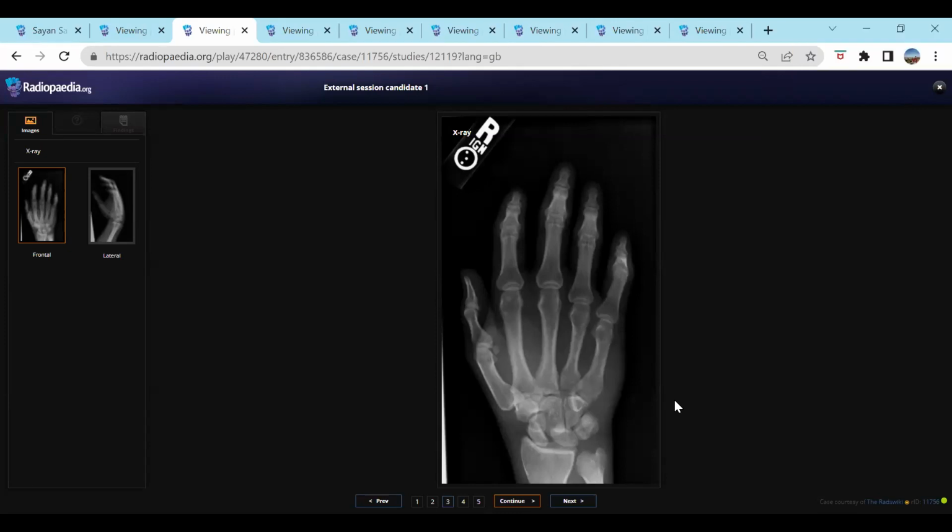Yeah. So I was ruling out first any arthritic changes and any fracture, because since the patient presented in ER, fracture was my first priority to rule out. The patient has come with a sports injury. So, I mean, you don't have to rule out arthritic changes in this. There is an increased gap between the lunate and the scaphoid. Okay. So I am suspecting a scapholunate dissociation.